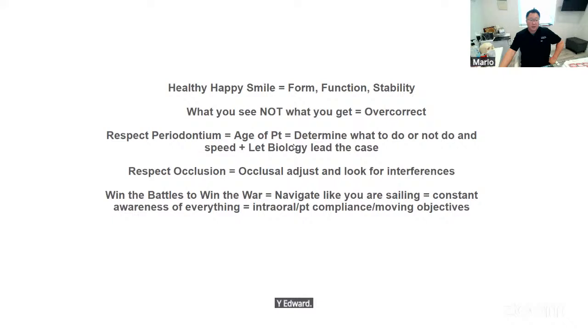All right. And then also, I always remind myself, with all that in mind, respecting occlusion is very important, right? How our teeth fit in. Our teeth are like a puzzle, especially for adults. It's already been occluded for so many years. Patients are chewing, they're eating, they're grinding, and there are different shapes. All the teeth are now in different shapes, in different fits. So you have to respect that.